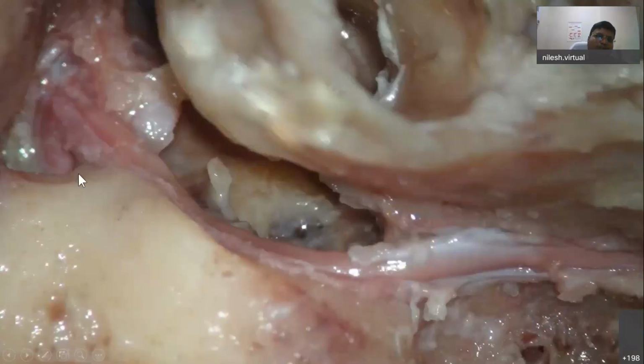Then we know from the internal auditory meatus, the facial nerve will take a C type of turn. So the labyrinthine segment is something like a C you will see. C type of turn, and then suddenly it will take an acute V turn to form the first genu of the facial nerve. Then there will be a dilation in the facial nerve, which is nothing but the geniculate ganglion. Then distally it will form the horizontal segment of the facial nerve, exactly posterolateral to the pyramid.